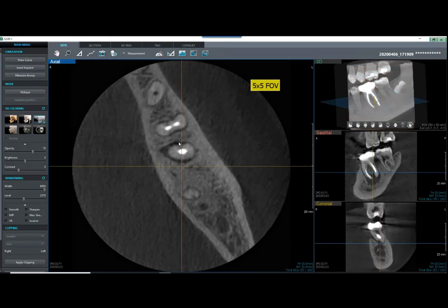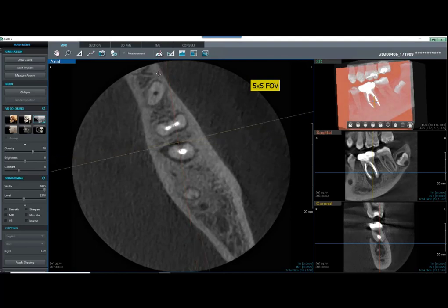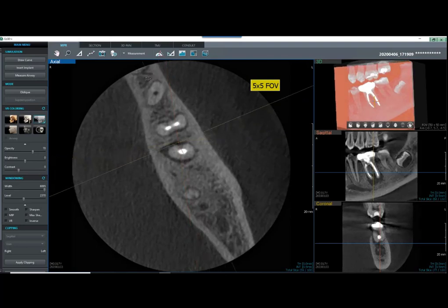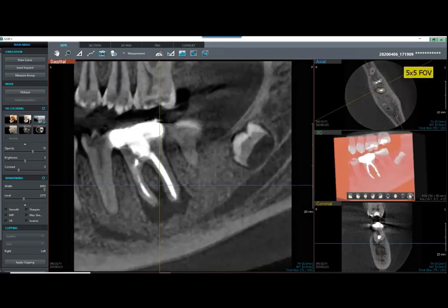I'm going to go ahead and double click on the area of interest. And Paul, we talked about maybe rotating this line around a bit to go through the long axis of that. And tell us a little bit about what we're doing here. So rotating that just gets a better view in the sagittal there, in my opinion. Right. So now we'll switch to the sagittal view.